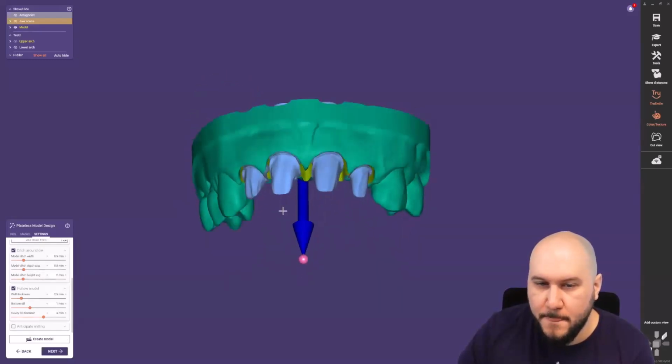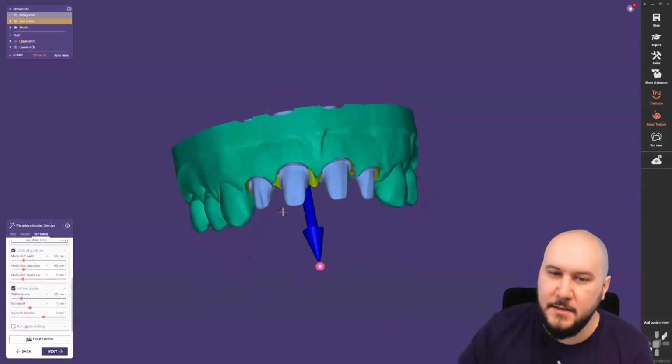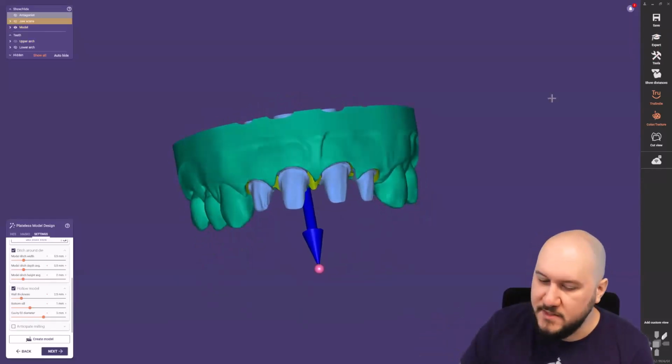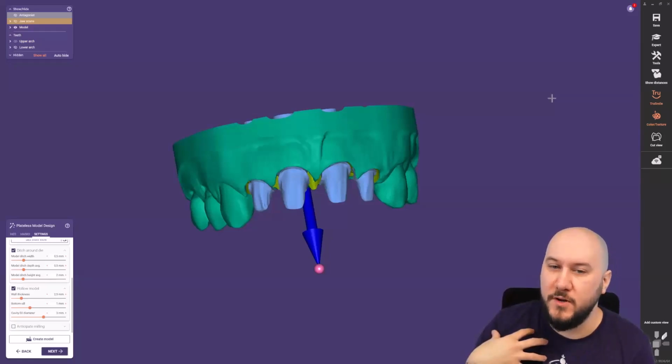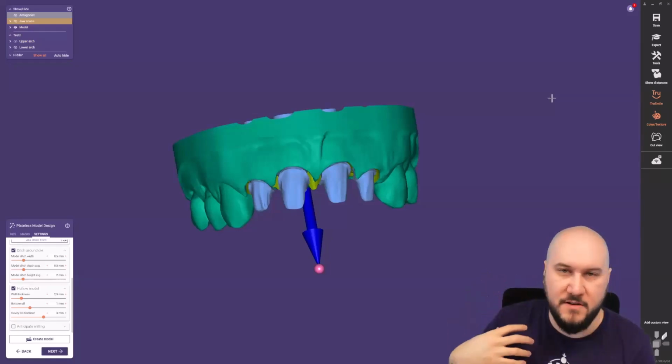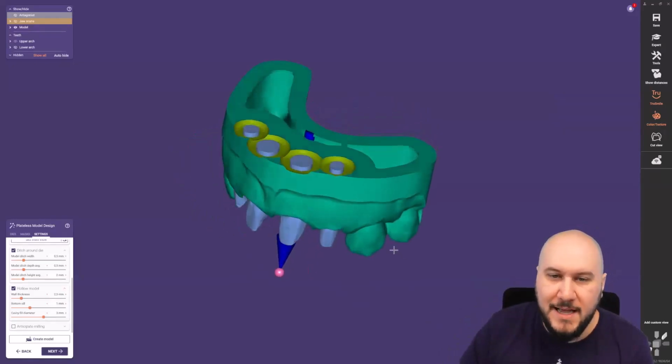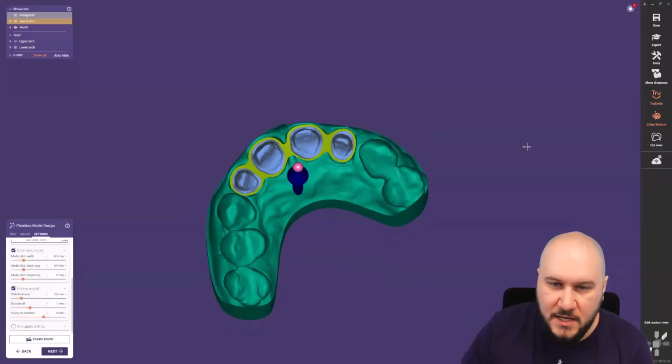So also, if this is a PLY or OBJ, in the expert mode tools and settings, you have the option now, for example, if you work with color printers like Stratasys and so on, that you can also print them later on in the color module. So there's no setting needed. Just go to expert tools and check for the color printing model type.